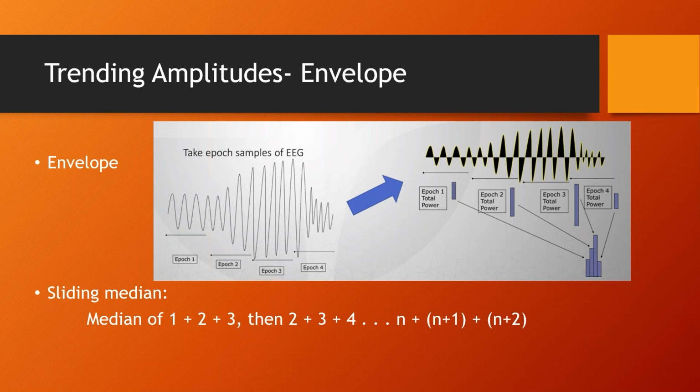What that does with the envelope trend is it tends to help us even out artifact. So if you look at the data of, let's say, a daily temperature or something like that, you'll see it bounces up and down quite a bit during that day. But if you spread that out over a week, you get a much more even appearance of your graph.